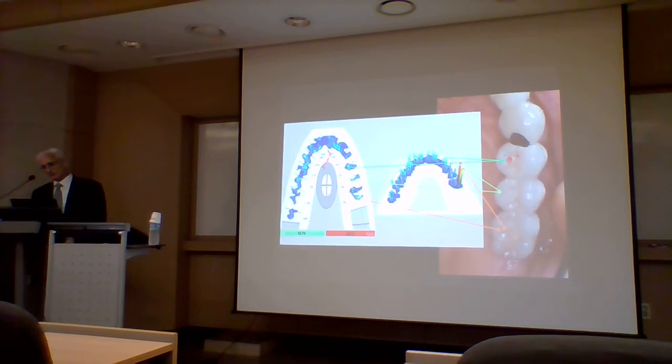And this is an interesting contact. It's more forceful than the neighbor, but look at the difference in mark size. They are similar contacts, but the mark size differs greatly. This is less force, bigger mark. This is more force, almost no mark. And this is the highest force, very small mark.